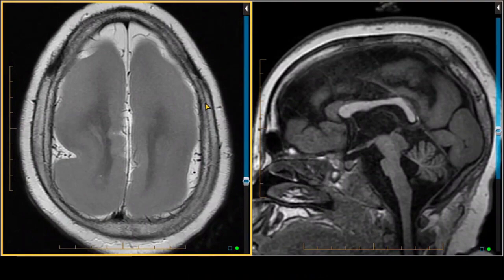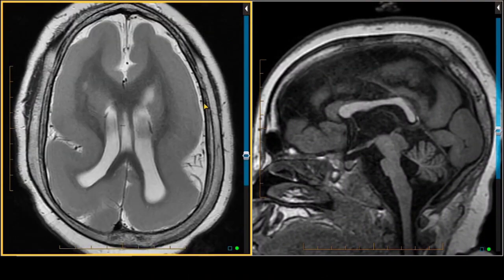This is an MRI of the brain in a child with seizures and developmental delay, and we can see a severe paucity of sulcation. The brain surface is relatively featureless. We see a very rudimentary sylvian fissure here on the right, and a shallow version of a similar structure here on the left. So otherwise, it is very featureless.